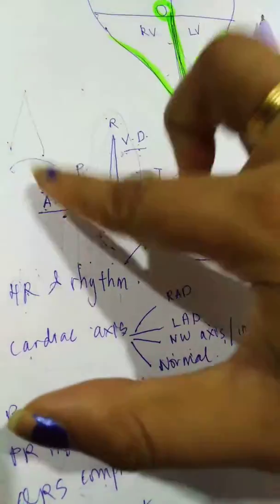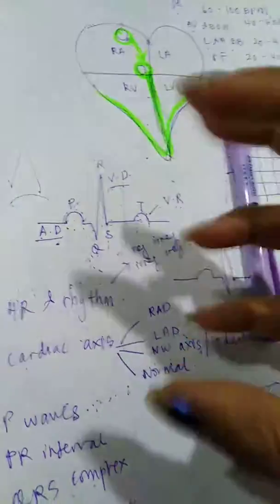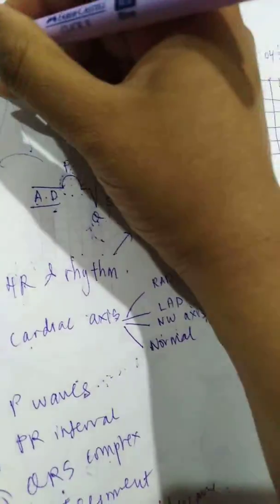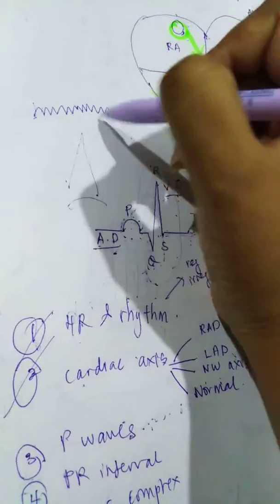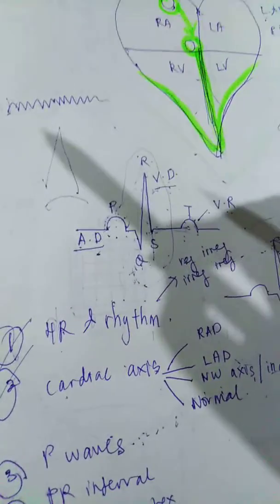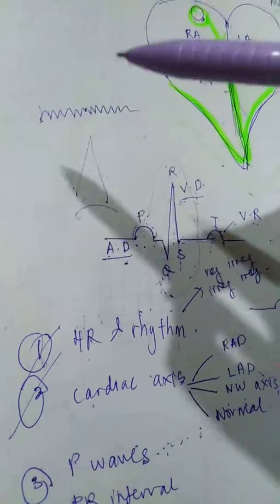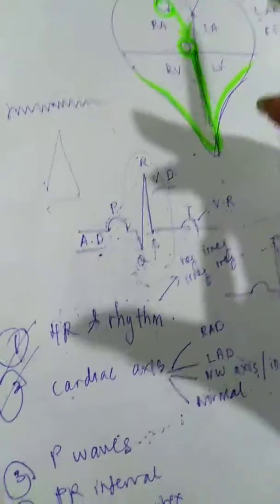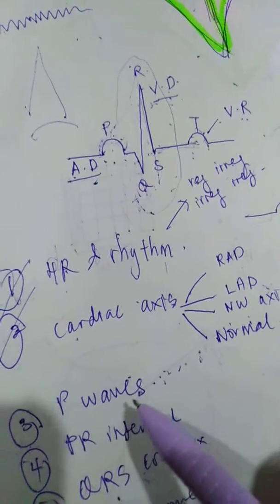Okay, if they are present, then you need to check if these particular P waves are followed by a QRS complex. By right, every P wave needs to be followed by a QRS complex, but sometimes a P wave will have a dropped beat, which means there's no QRS complex, and you see them in conduction defects. And then you need to look at whether the P waves look normal or not. You need to check the duration of the P waves, if they are lengthened, so much lengthened that they look more flattened. Their shape, sometimes they can be upright, they can be peaked.